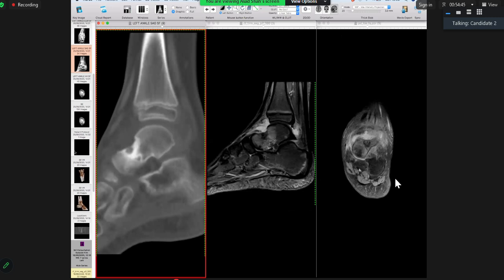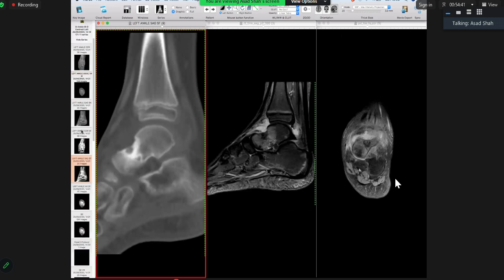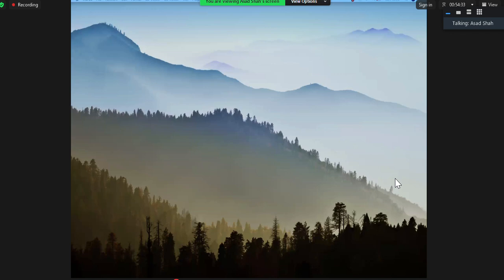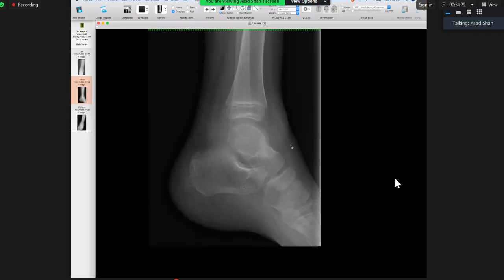I mentioned the neck of the talus. Once it's obvious, it's obvious in the exam setting or in retrospect. But the key findings, I think you picked up very nicely on X-ray. One is the soft tissue swelling, and then there was sclerosis, right? If I'm reporting this X-ray, I think this is JIA or effusion, and then this one could be osteomyelitis. I wouldn't have said this is osteoid osteoma on an X-ray.